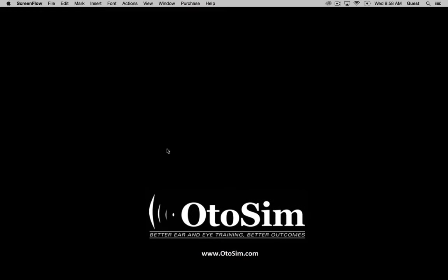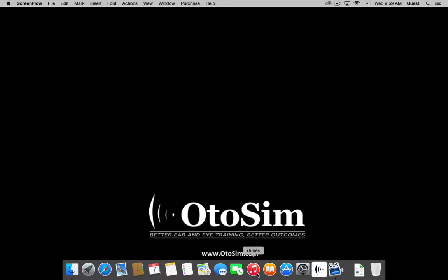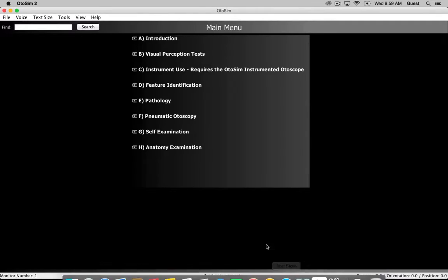So right now on the screen, you will see our logo, and I'm going to open up the OtoSim 2 software, which is in your applications folder at the bottom. OtoSim 2, click, and this is our splash screen. And we'll go over this program in fairly good detail to show you some of the features that are different from our previous version, and also explain some of the importance of our newest additions.